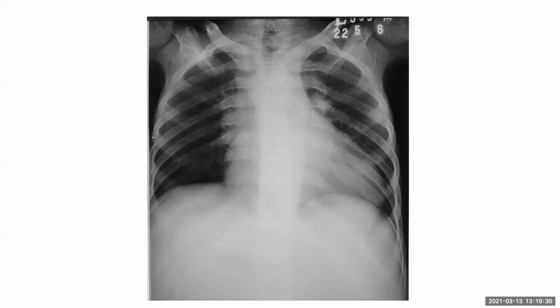This could be due to... You said the heart appears a bit large. So yeah, what else would you look for? I'll see the vertebrae for any H shape or something. I'm not seeing the vertebrae clearly, and the bones look a bit osteopenic and gracile. So this can be a hemolytic anemia, maybe a sickle cell anemia.